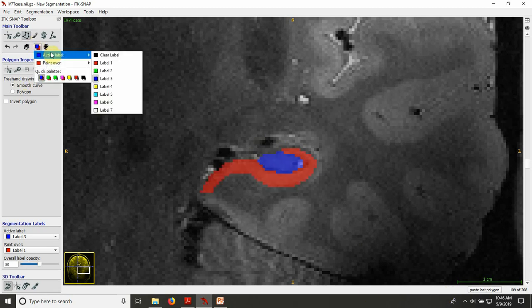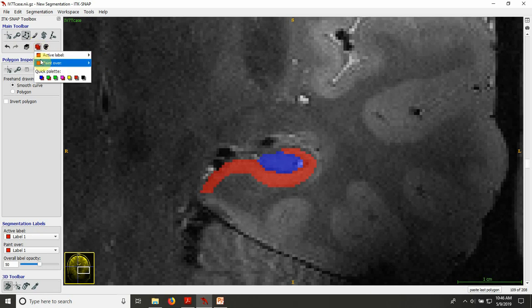I'm gonna adapt it. Similar as for the outer borders, we actually use the borders of the dentate gyrus to determine some other borders for subfields, so it's important that this border is correct before we move on.